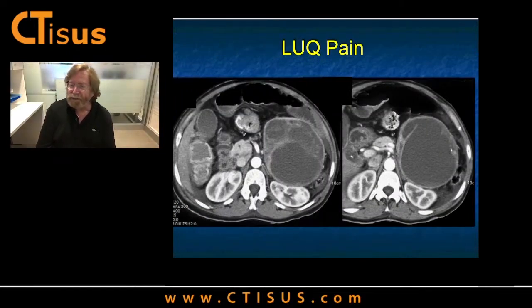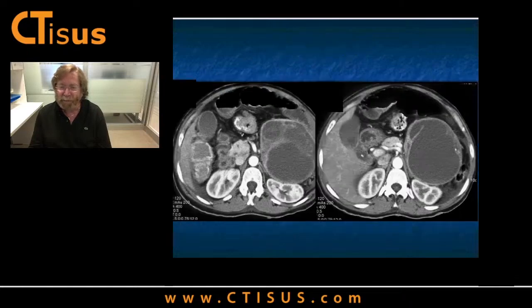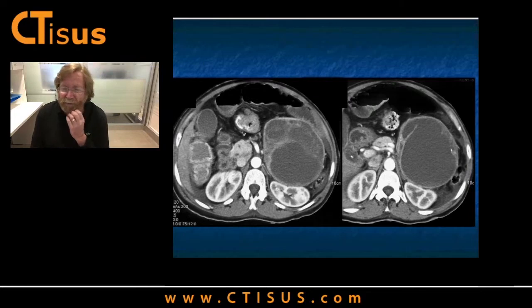Another patient, left upper quadrant pain again. Okay, cystic lesion, thickened wall. What gives you cystic lesions? Metastasis, ACC, pheochromocytoma, a bleed in a lymphangioma or a ganglioneuroma like I showed you, AML which bled, myelolipoma. What could this be? This image doesn't add much, nor does this, but cystic, septated. You'd go through a complex cyst that maybe bled. You go through hydatid disease if you're in a crazy part of the world. Not that there's crazy people or crazy parts of the world, but a faraway place from Baltimore, let's say.